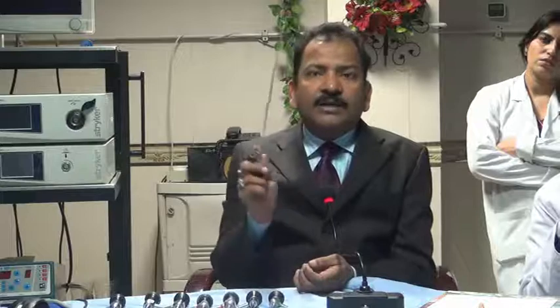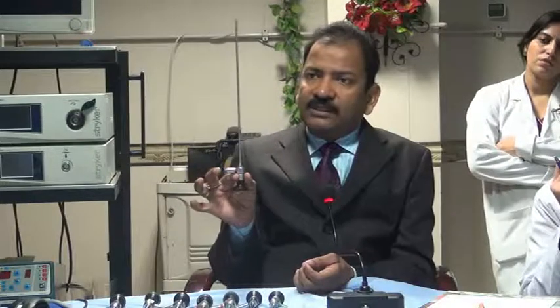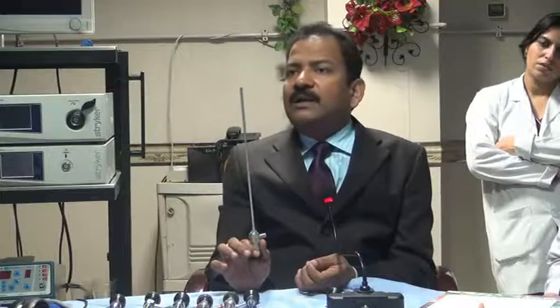Now for a standard operative hysteroscopy you need 4 mm. This is called either a hysteroscope or a cystoscope. This is the same instrument. If it is used by the urologist, it is called a cystoscope; by the gynecologist, it is a hysteroscope. This is 4 mm. Then comes 5 mm. 5 mm is actually a laparoscope. But this laparoscope can only be used for simple procedures like diagnostic laparoscopy, ovarian drilling, simple tubal patency test, because the field of vision will be small. If the diameter is small, the field of vision will also be small.